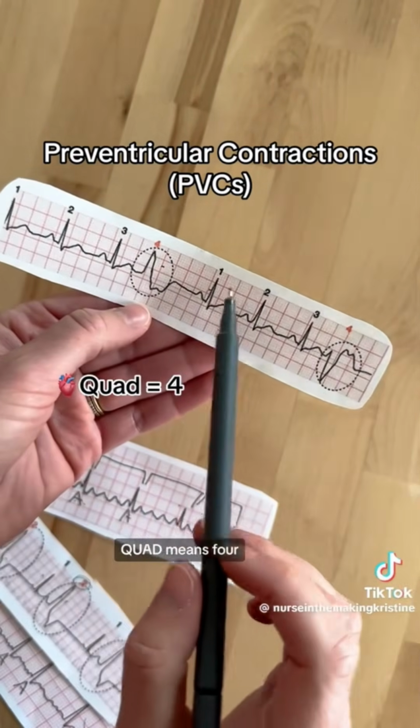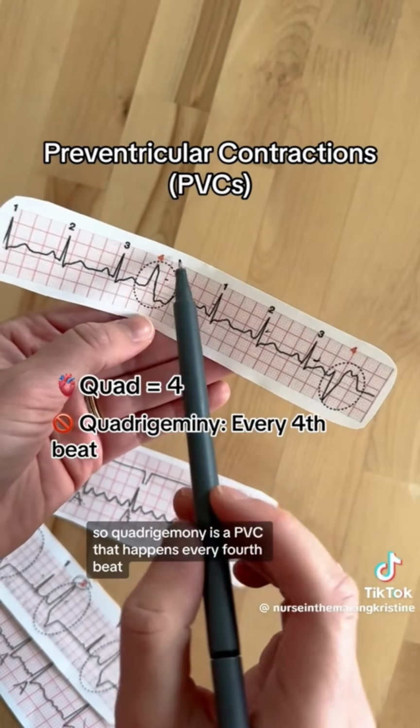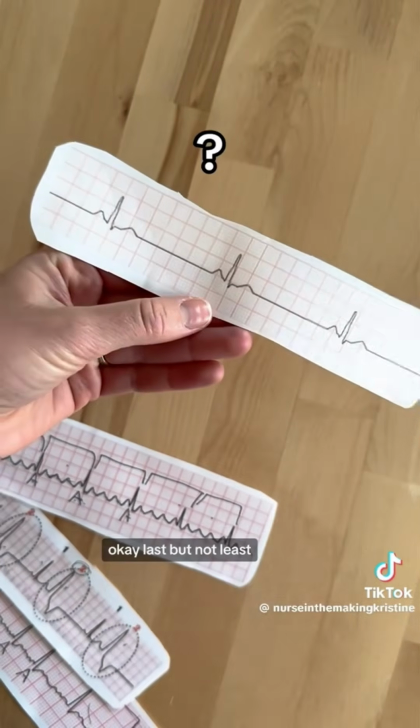Quad means 4, so quadrigeminy is a PVC that happens every fourth beat. Okay, last but not least is this strip.